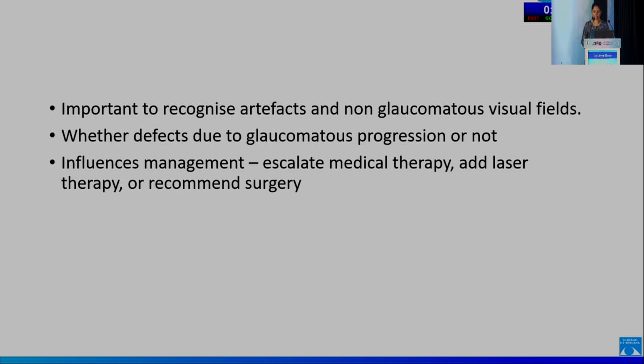It is important to recognize artifacts and non-glaucomatous visual fields, whether the defects are due to glaucoma progression or not, because it influences the management, escalates medical therapy, helps in addition of laser therapy or recommends surgery.